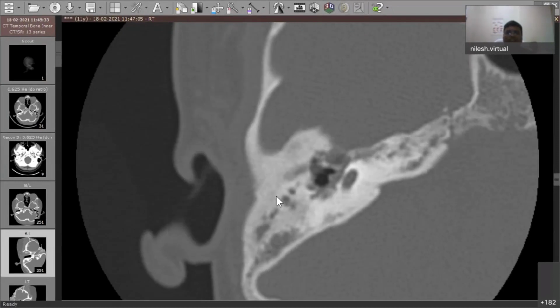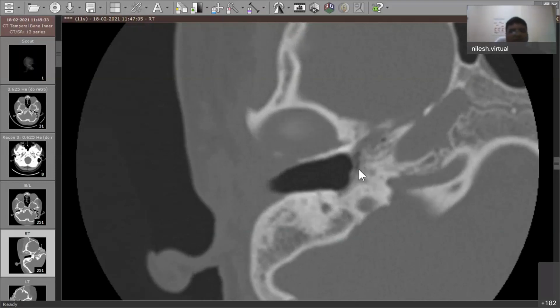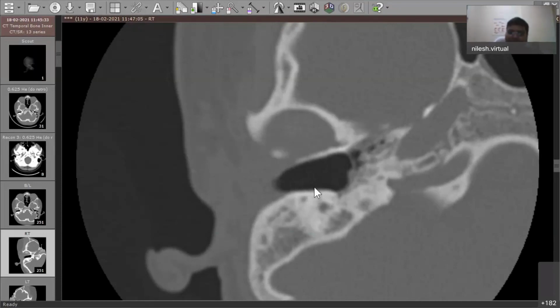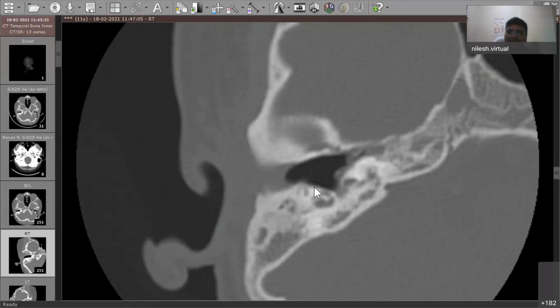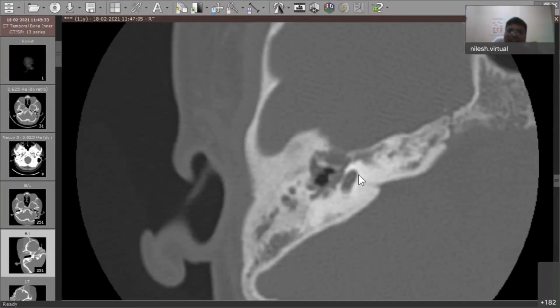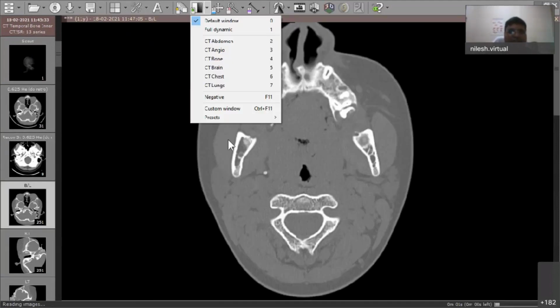And what is this case? This case is of adhesive otitis media. So the patient came because he is not able to hear, and when we saw endoscopically, it was just adhesive otitis media. So we thought we'll get the scan done, and anyway it was a profound hearing loss. It was a case of adhesive otitis media with cholesteatoma. We have to make the ear safe, but we cannot guarantee, or we should not guarantee actually. There is no possibility of hearing in this case because the entire cochlea is absent. There is no cochlea.